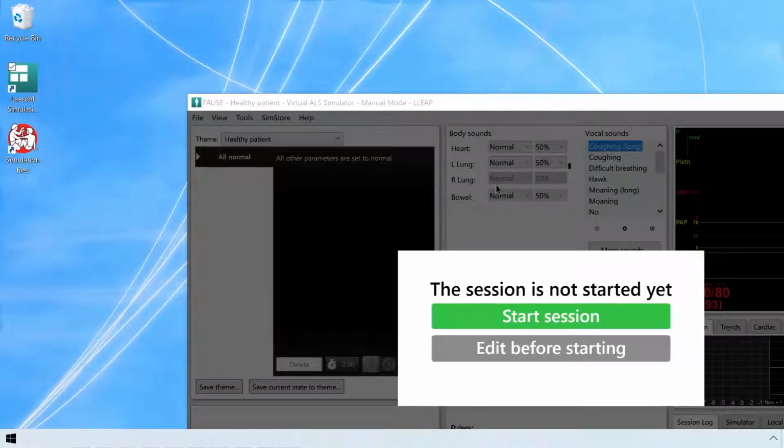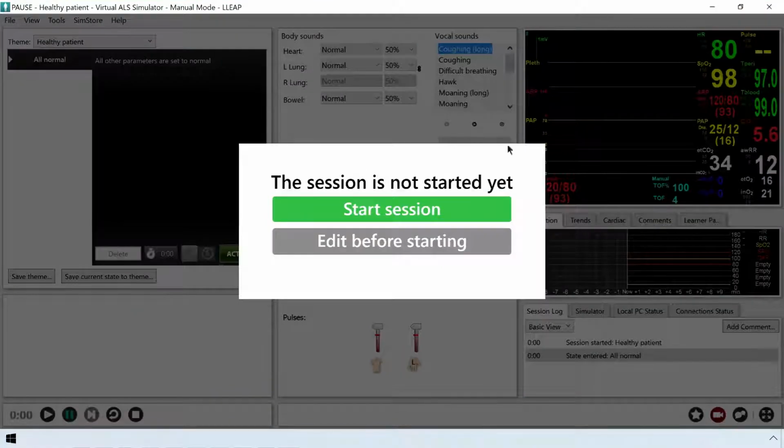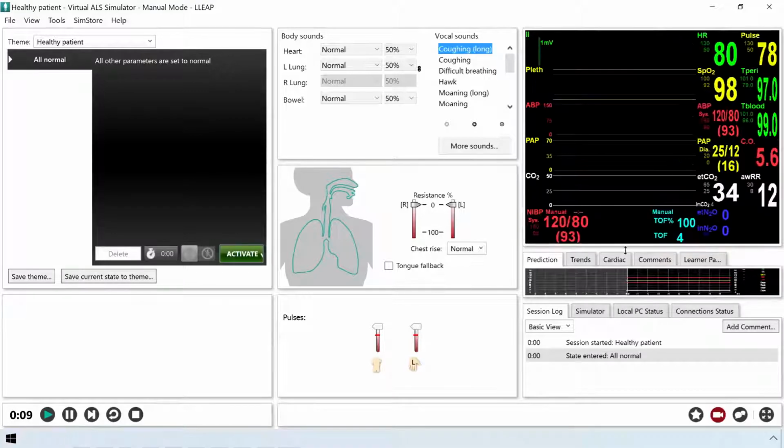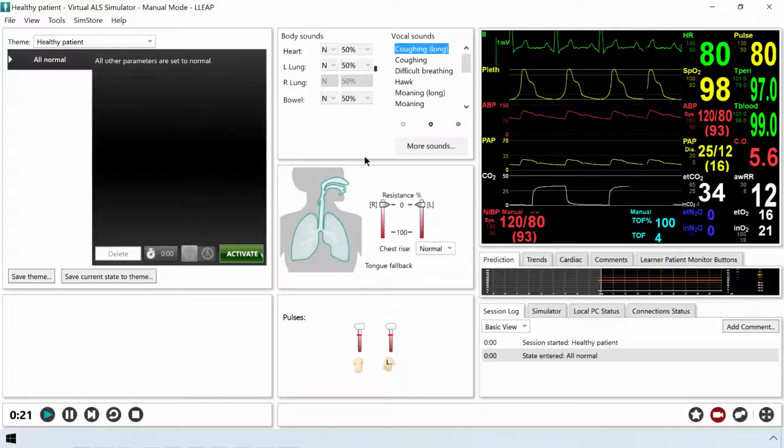Normally it doesn't do that. Usually it just fills up the whole screen. Okay, so let's just go ahead and start this. Now, there are multiple ways that you can work with this funky voodoo. I'm just going to make this a little bit bigger. Man, it really draws weird on my screen. Like, I have a very high DPI screen, and this is very weird. I'm used to it on like lower resolution.